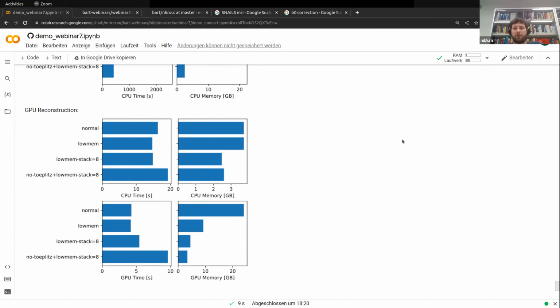I think John already mentioned in the chat one way: to just split up the separate coils of your k-space and do the reconstruction on that, either with pics or just with the inverse NUFFT. Then you can compare. I did not run the reconstruction here in the Google Notebook. Can Christian try to prepare something to show the difference? I'm working on it. Okay, thank you very much.